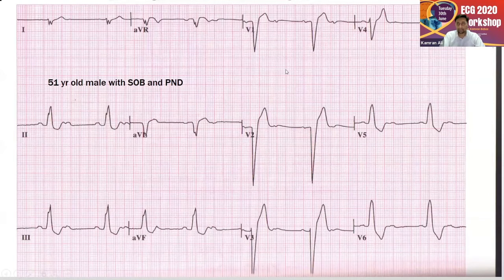All right, coming to the next one, 51-year-old male with shortness of breath and PND. So what do we see here? Yes, ST elevation in aVR normally tells us there is extensive ischemia going on. So most of the time, aVR ST elevation is a grave sign. Either there is triple vessel disease or there are signs of left main disease when aVR is especially elevated.